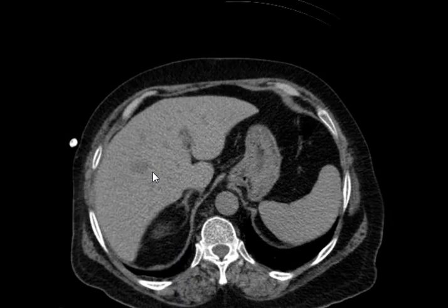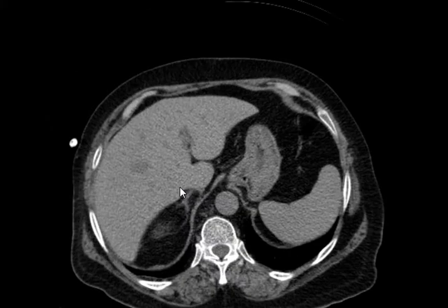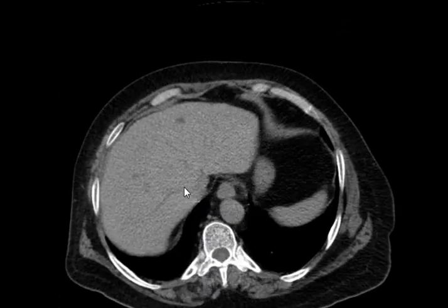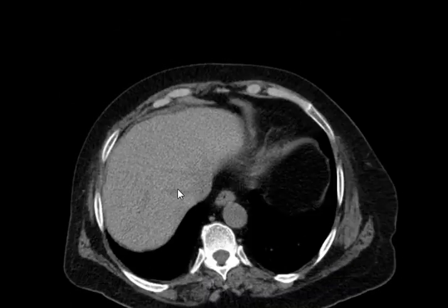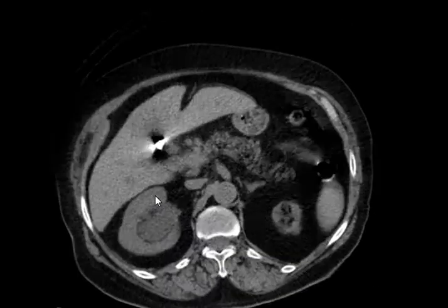First of all, this is without contrast. In order to confirm, you need contrast. You can ask for it, or you can just pull it and see. Second, you take a quick look from up to down, and then you decide where to focus, because the abnormality might be down. You don't know.